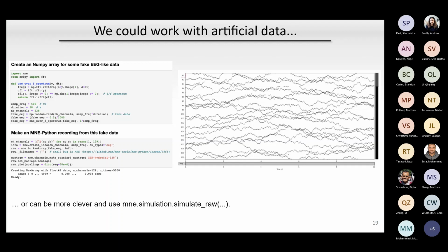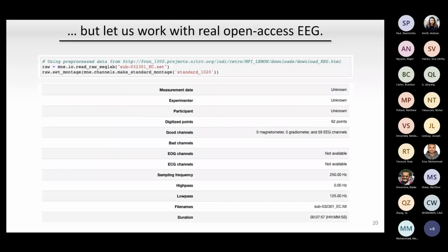And then I can use the plotting function, so that would be my surrogate EEG there, which looks kind of like EEG. The only difference here is that the channels are not so well correlated with one another. But I wanted to show that just to show you that these libraries work well together. You can do all the NumPy stuff, work with your data, change whatever you want, and then you can put it into MNE and use it, and it will go directly if you want.